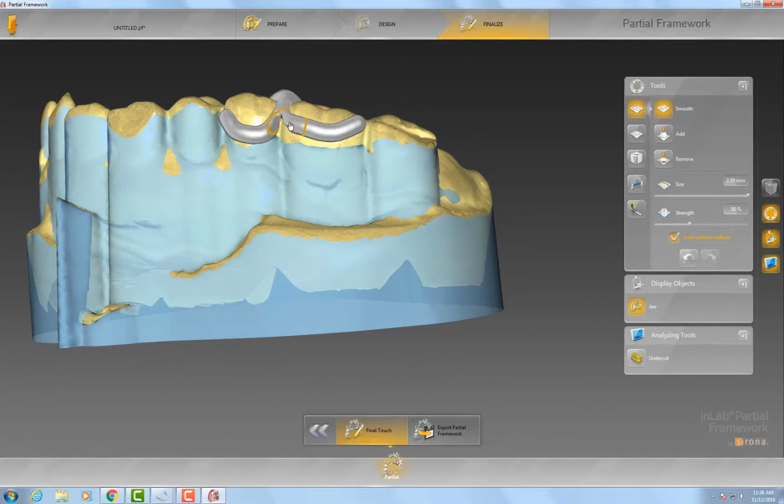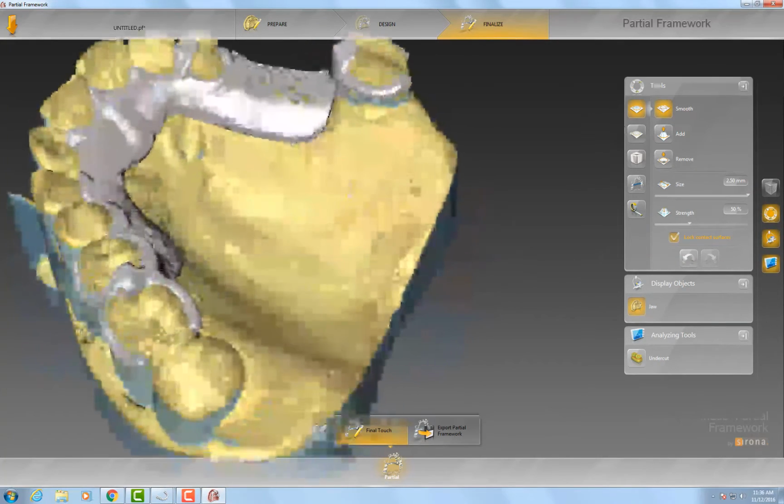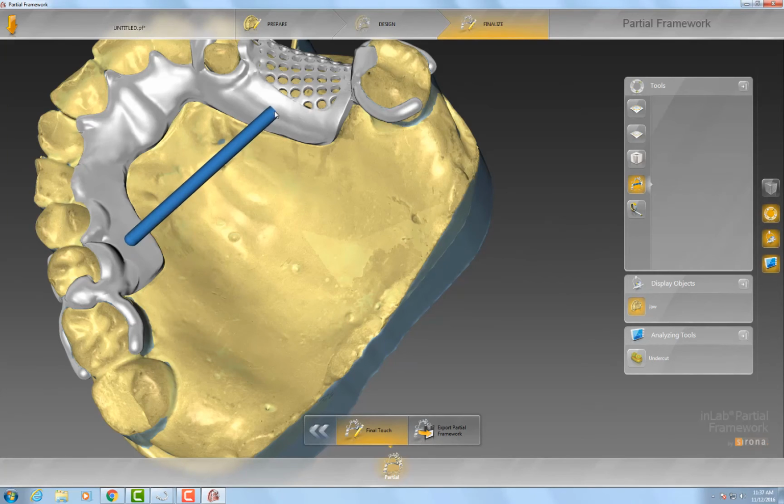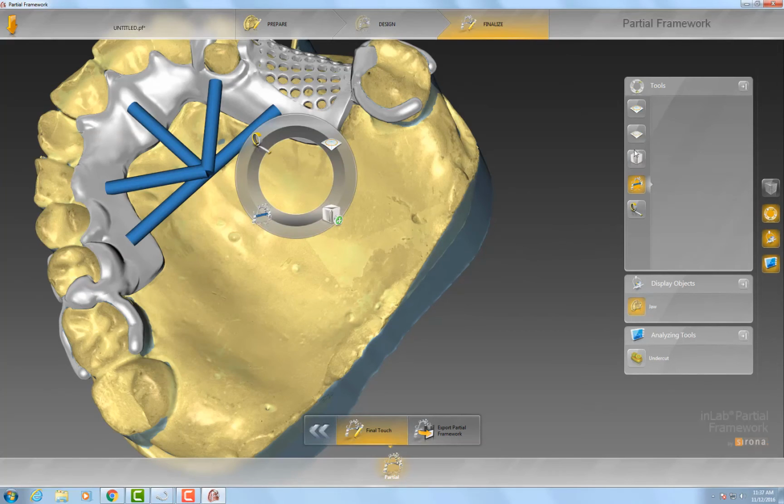All I'm really going to do is go back and add some sprue points. This is a really nice feature. I sometimes like to over sprue mine. But see, this is another thing you don't have to buy, is sprue wax, because it's all taken care of for you. And then I go back and I hit add material. I just like to bead them a little bit.